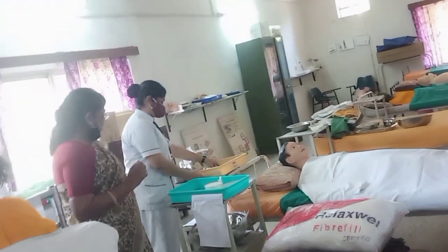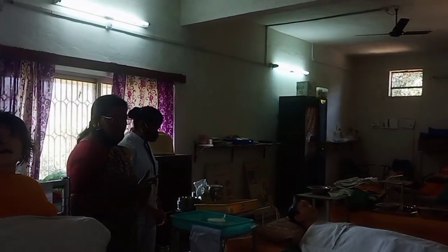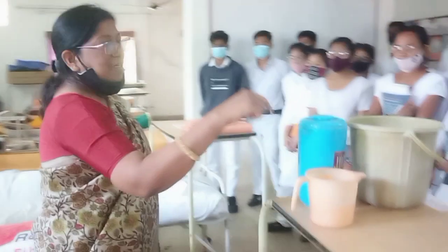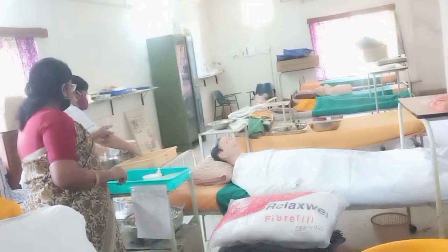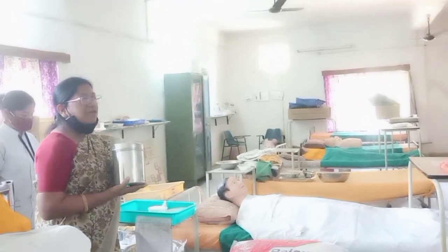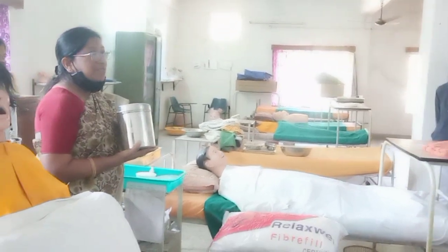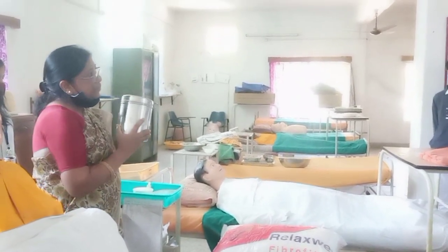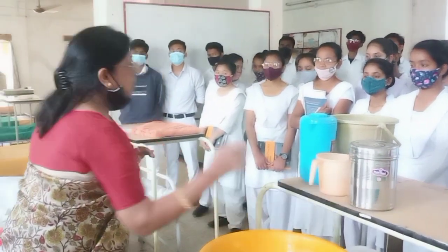Now I will show you some of the equipments to keep the lotion and warm water and cold water. So I have already this is plastic article है ना, and this is the steel article. First drum. This is the drum, we used to keep the drum for to keep the like gauze piece and cotton swab. This is a steel drum for the patient. You can use for the bed bath or any procedure.